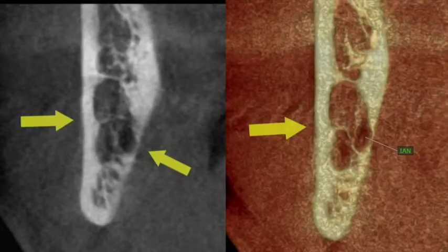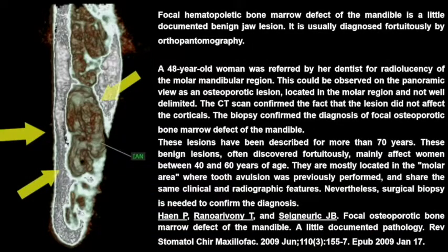There's thin slice. There's a little further back. This is what I can do, and sometimes you have to put up with the background because we can't separate. We're still working on the presets to try and separate different density tissues. And I can get sexy images of this. This is the same one.